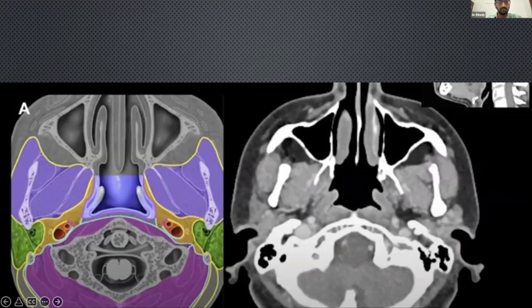And then in between these, we have the parapharyngeal space. Actually, this is the most important one, which will help us identify the origin of the tumor, from which space. So for example, if the tumor is coming from the masticator space, it will push the parapharyngeal space, which has predominantly fat and some minor salivary glands, so the fat will be pushed posteriorly, posteromedially.